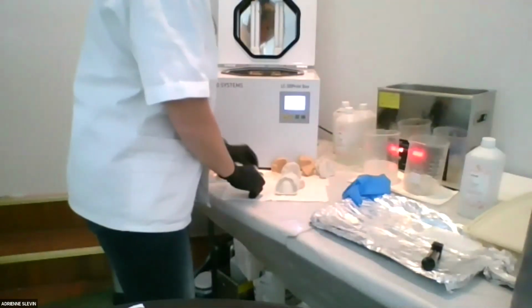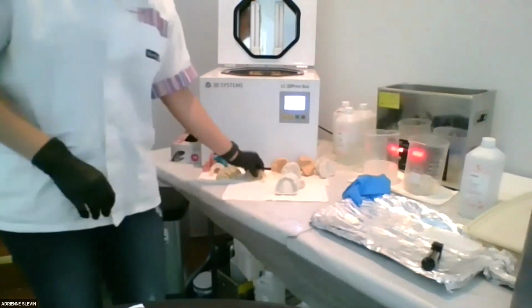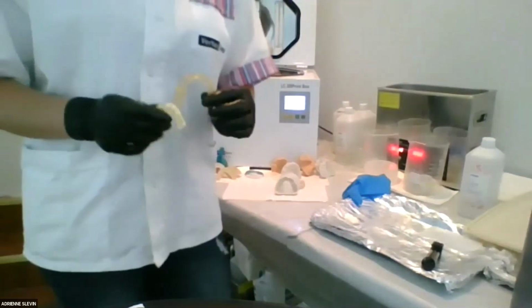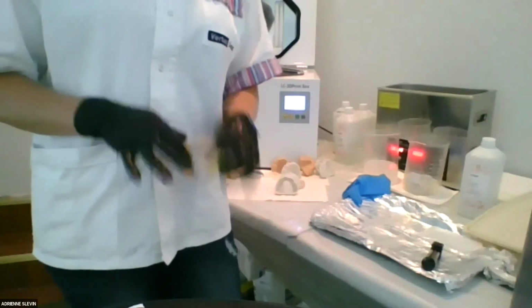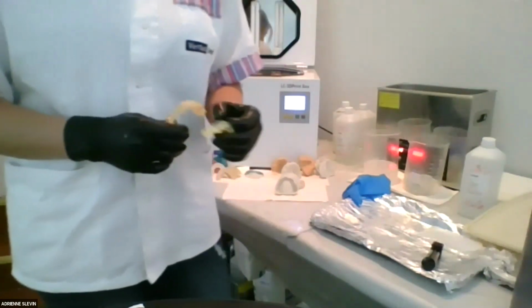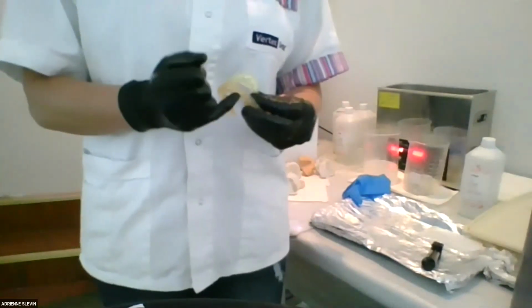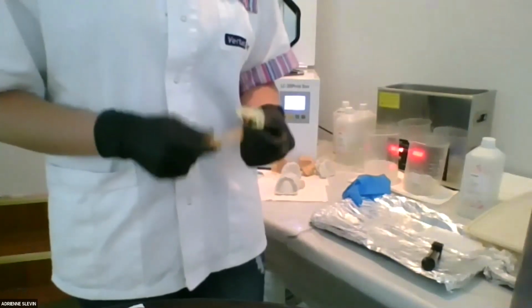And then I wanted to go over the changes in a surgical guide, and I have some images, but since we're kind of out of time, we tried to cram a little too much here. I'm going to make a PDF of my presentation and drop it in the chat or give it to Neil. Something you can do is put your sleeves in prior to your post-cure, and you'll have a better grip, and you can even use some resin as a glaze.